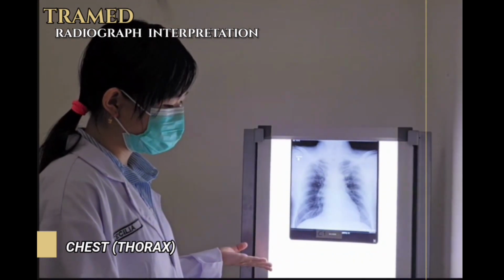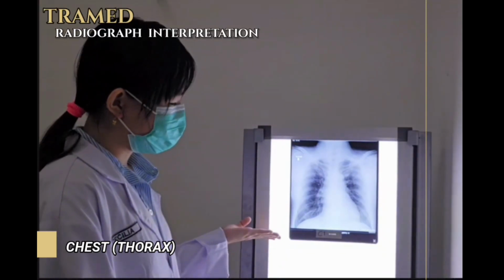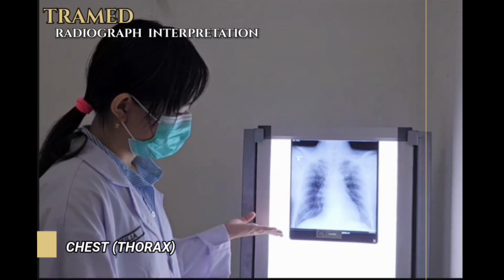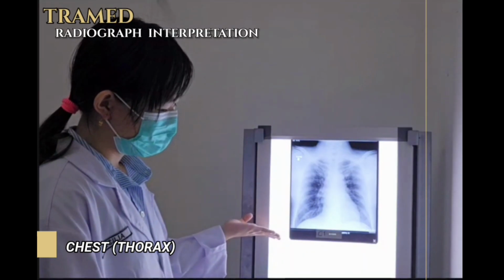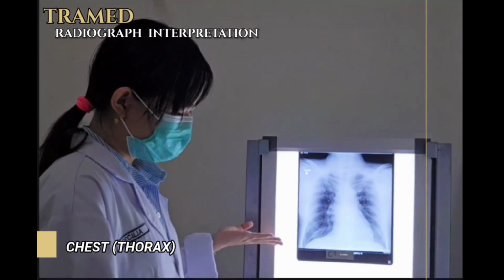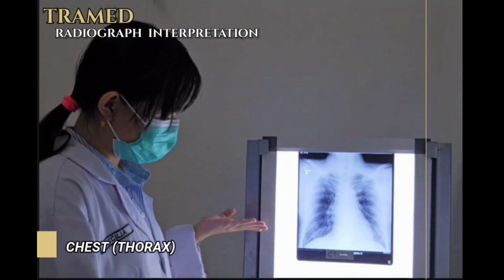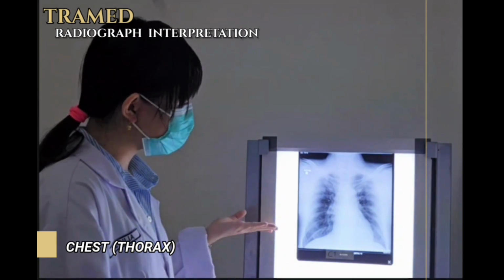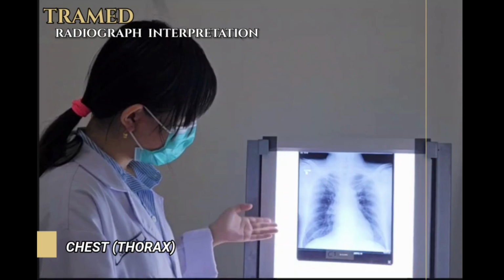There is no inadequate exposure or decollimation, and there is no major artifact. So it's normal. And it's AP projection. And in this image, it's about the thorax. This is the image of the chest or the thorax. So to evaluate the image adequacy, this is based on the image. The penetration is adequate, and after that the rotation is symmetrical.